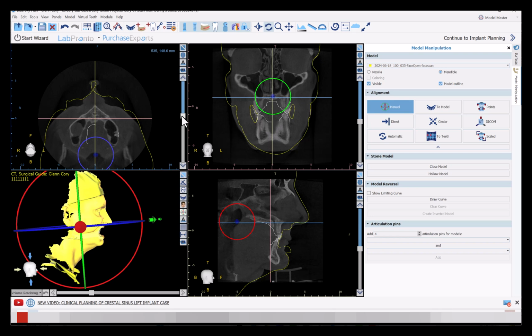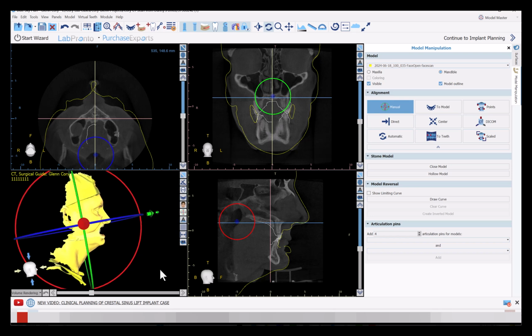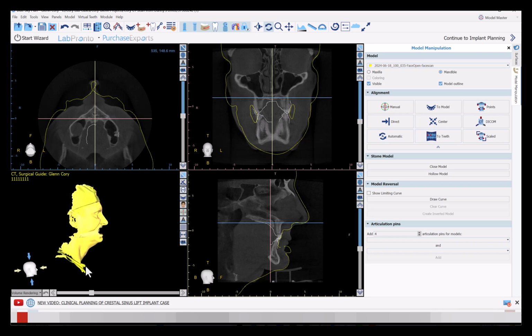And now it's all oriented, so when I go into whatever program, Exocad, 3Shape, Blue Sky, I'm not relying on doing this, okay? I've spent hours trying to do this kind of manual stitching to really just get close and still not have a ton of confidence that we're really good. So the ultimate point in all this is if you want to make your life easy, utilize that software to its advantages, let it stitch things, and then pull them into your other programs for your design of whatever you're doing, okay? But that's just one man's opinion.